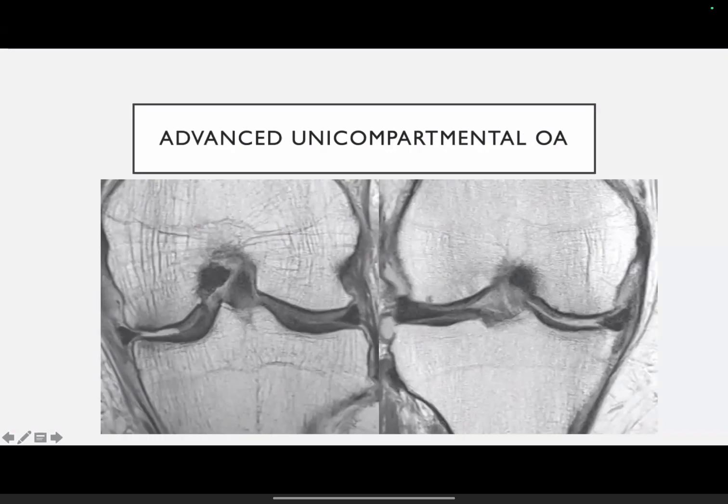So these degenerative knees are very commonly seen because most of the patients who come for MRI come for the evaluation of various compartments. Everyone knows on the X-ray that the patient has grade 4 arthritis or grade 3 arthritis or grade 2 arthritis, but the advantage of getting the MRI done is that they can actually evaluate the 3 compartments, so that the patient can be taken up either as a candidate for total knee replacement or a unicompartmental arthroplasty, or if he's in a younger age, around say 50, 55, may be given a chance for a high tibial osteotomy depending on how bad his compartment is loaded.